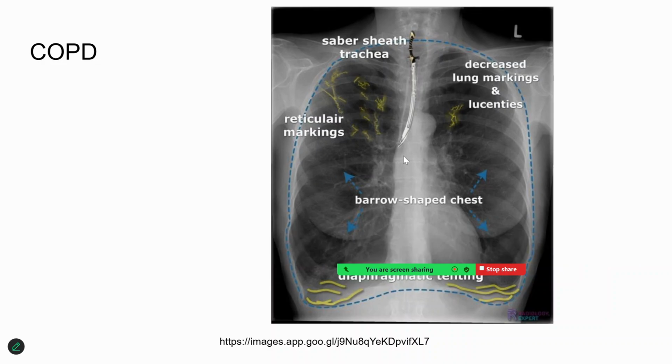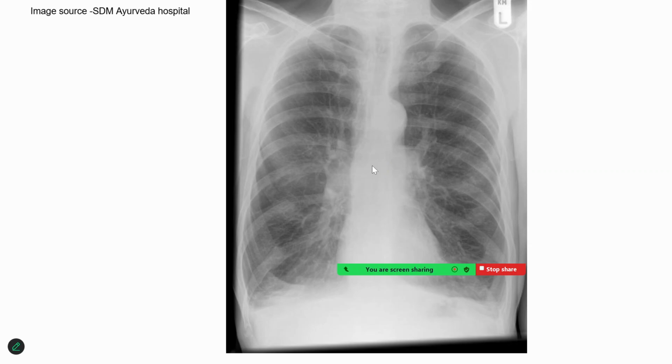The shape of the chest tends to be altered due to the reduced capacity of the lung tissue to take in air, and hence the shape of the chest becomes barrel shaped. Or the diaphragmatic surface may also become irregular. There could be folds of the diaphragm, or the trachea may be somewhat curved, which are some of the changes produced due to chronic bronchitis.